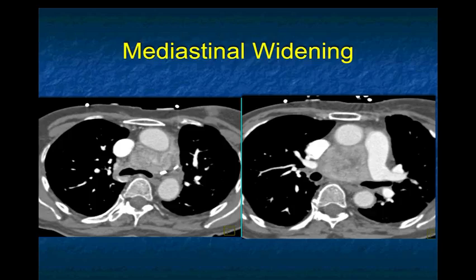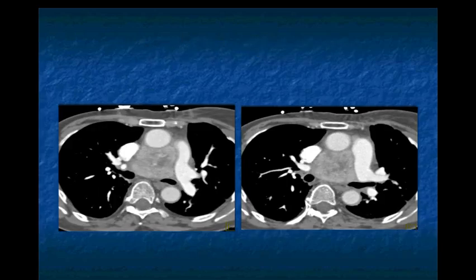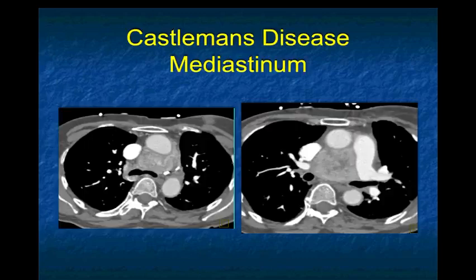It's somewhat vascular. You can go through metastatic disease, a good thought. You can go through infectious inflammatory disease, a good thought. This is kind of a very, very unusual case. Other things that occur in this location, usually more vascular, would be paraganglioma. That's not a bad location for a paraganglioma. But when you see adenopathy that's slightly enhancing, you think of malignancy, you think of infection, and then when that's not the answer, you think about Castleman's disease. And this was a case of Castleman's disease of the middle mediastinum.